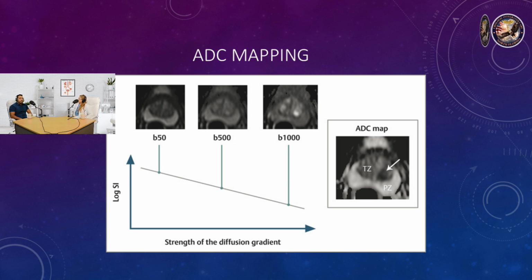Well, those calculated B-value images are nice because they help really accentuate where you see tumor. But there are definitely certain B-values we like to use to do this ADC mapping. At very low B-values, and as you get to very high B-values, the fitting of the B-value to the signal is not so simple as a straight line like this.